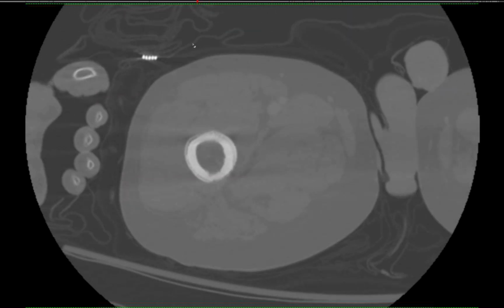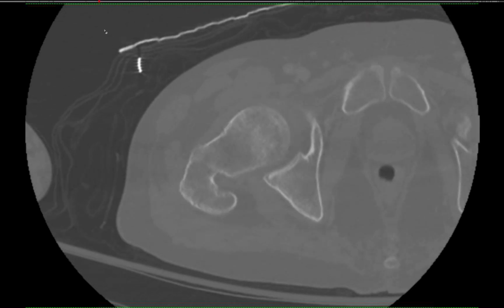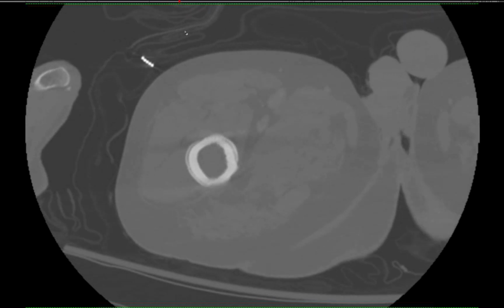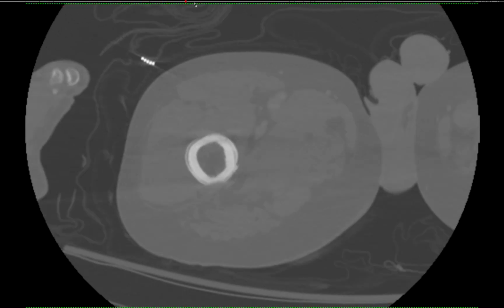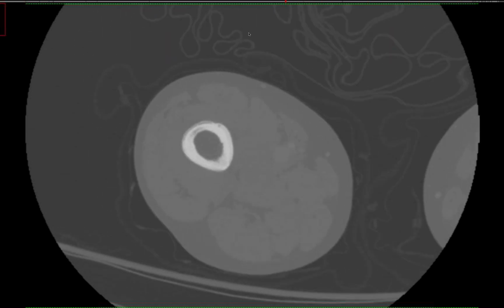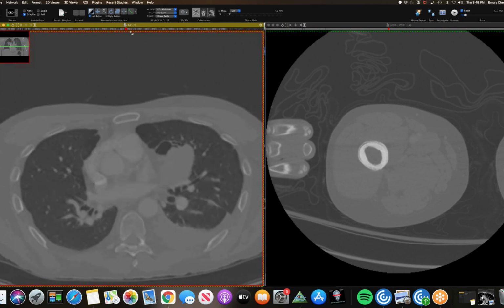This patient has a diagnosis of lung cancer. So this is one of the more impressive ones I've seen of that, and you can actually even see it on the forearm, which they included part of. You can see it a little bit there too. Was it a small cell or a non-small cell? Yeah, it was an adenocarcinoma. Oh, okay. So here's the mass.